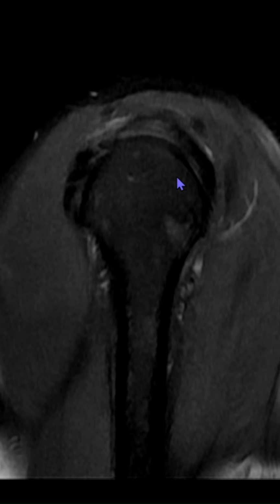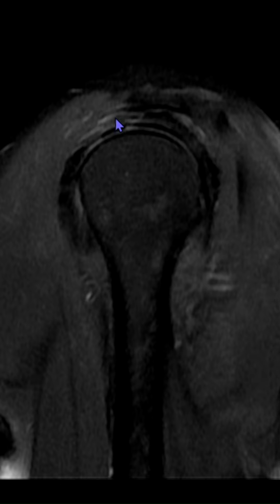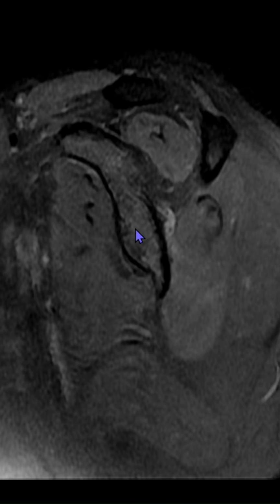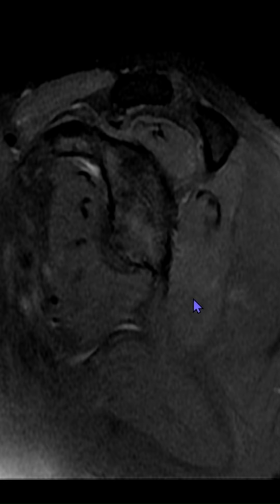There is the expected tendinosis, which is usually seen above the age of 60 years. But the one thing that we should not miss is the changes of denervation. So on closer inspection, we'll be able to see that this supraspinatus, infraspinatus, and teres minor muscle bellies appear bright. There is no similar changes in the subscapularis or the posterior fibers of the deltoid. Here we can see that this hyperintensity is limited to these muscles.